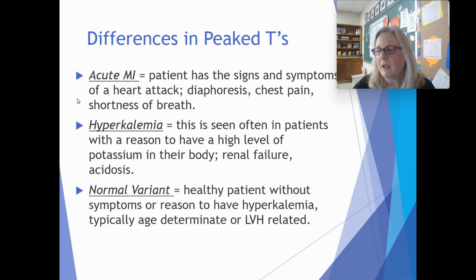And a normal variant, here we go back with the healthy patients without any reasons to have hyperkalemia. Again, typically age-related. This is going to be more younger teens, teenagers, those with peaked T's already. They already have a little bit of early repolarization. You'll see a peaked T with it. So those young male athletes, we talked about the Air Force people, will have these normal variant peaked T's. Again, if I'm going too fast, just slow down. You'll catch up eventually. You can always pause and rewind.